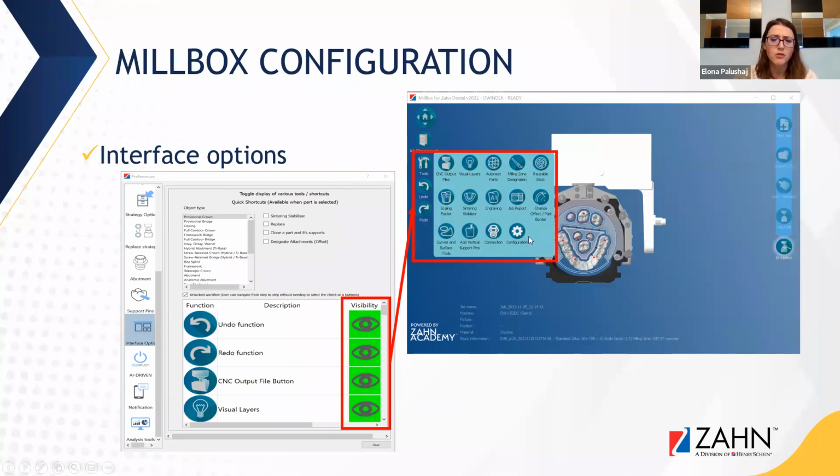So if you're going under tools and there's always just 3 that you're using, then hiding the rest of them that are never in use will help you get to those 3 tools that you do need faster, rather than looking through to see where they are. Granted, if you do it all the time, then you know where those tools are, but these are not frequently used tools, so it's hard to remember where the position is without going through and looking for which ones you need to use. So I definitely recommend that to keep your system cleaner and more user-friendly.